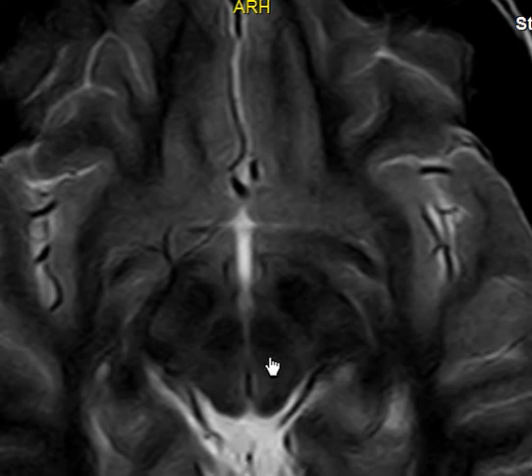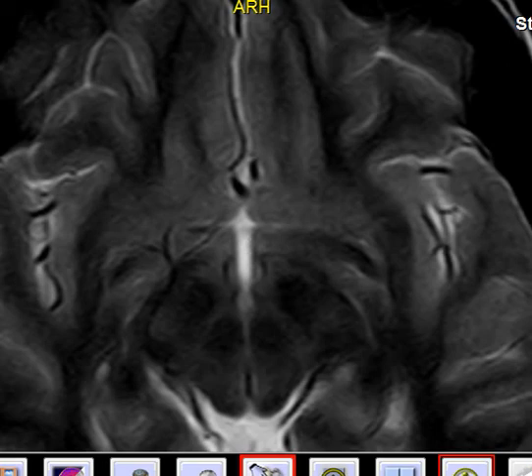When there is Parkinson's, it's not as black. It's a little bit lighter in color. One of the things they do is deep brain stimulation, some therapies, using stimulation of these parts of the brain. It should be somewhere here. You can see this black thing here. These are the substantia nigra.